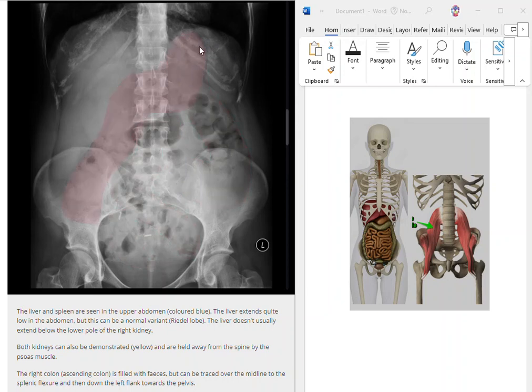Okay, now watch. Watch when I connect the rest of the large intestine. Boop, you see that loop? You see the overlap? It's overlapping itself or overlying or superimposing itself. Because remember when I showed you the flexures, I had to turn that skeleton in a lateral so that you could see that the flexures curve posteriorly. So that's where you get that loop-de-loo and the superimposition.